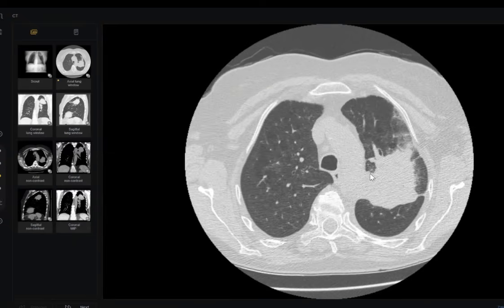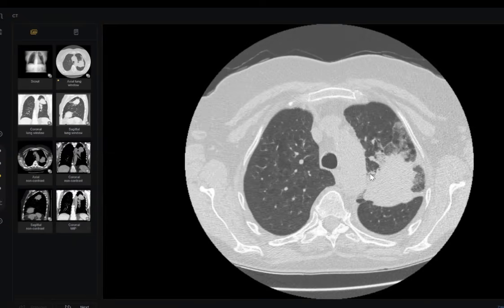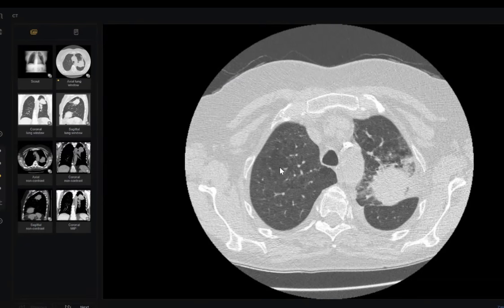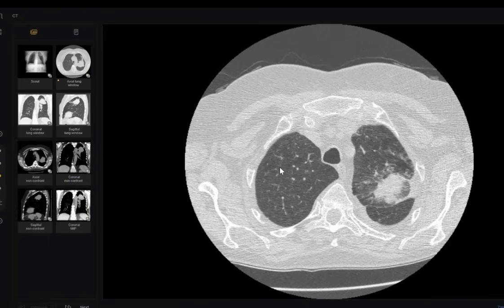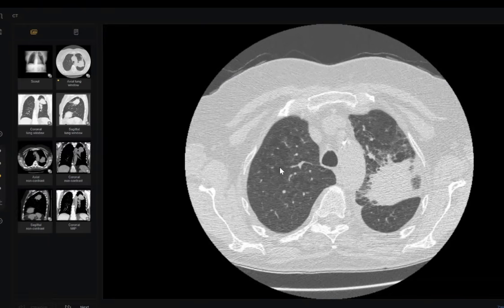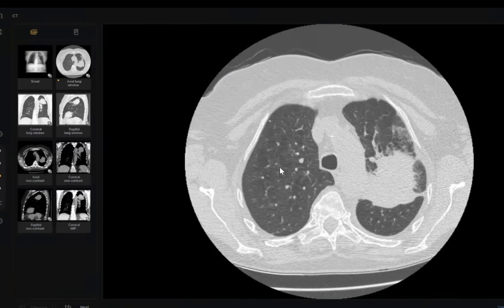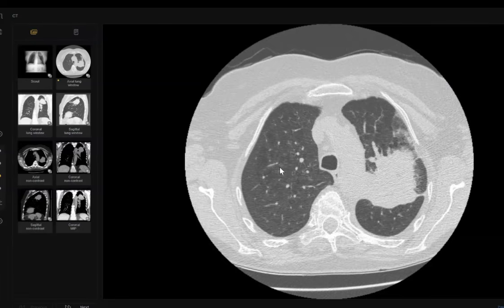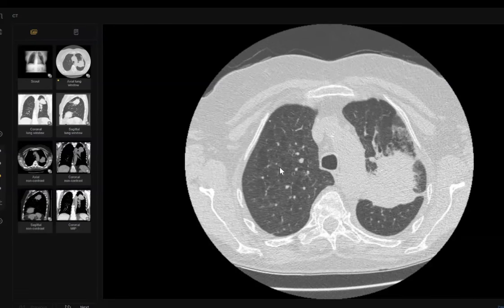Nowadays, most recently, after diagnosis, you forgot to talk about the bilateral apical centrilobular emphysematous changes. So this patient is a smoker, and this is a very important predisposing factor for lung cancer. Okay, doctor? You forgot to see, doctor.